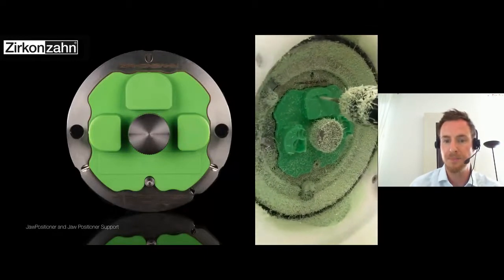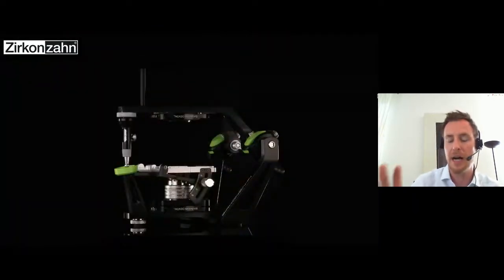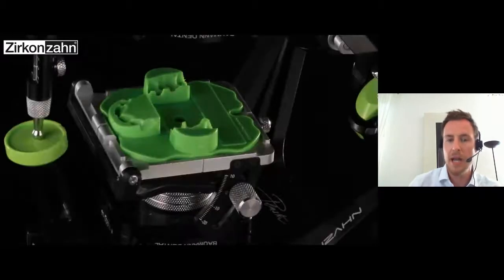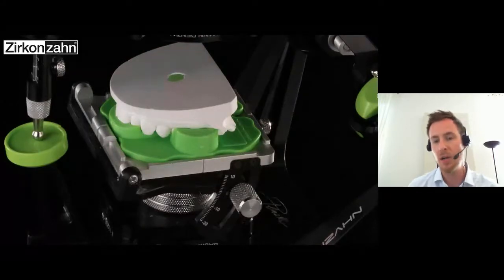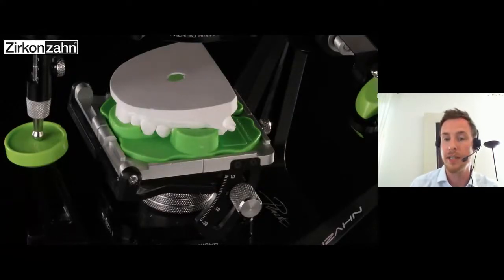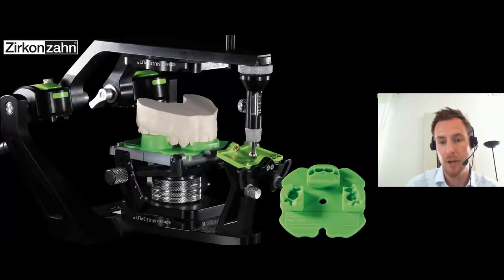And afterwards, I take this jaw positioner out, place it onto the articulator table. Onto this table, I will place the milled or printed model, and I fix it with plaster in a conventional way onto the upper socket. And the lower jaw has to be placed in the correct position by using a transferring, like a bite registration. You can do that with the bite splint module, or maybe the doctor has sent you a silicone bite reg, and you can use that to bring the lower jaw in position.